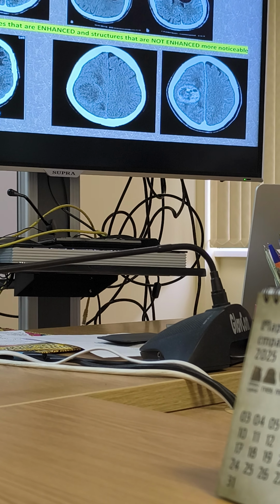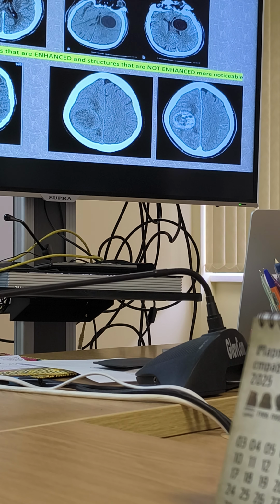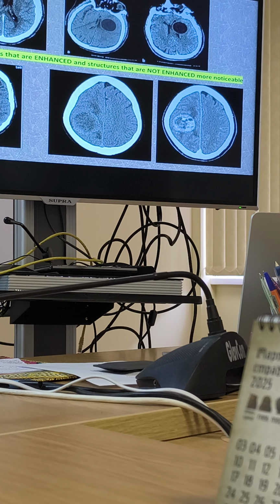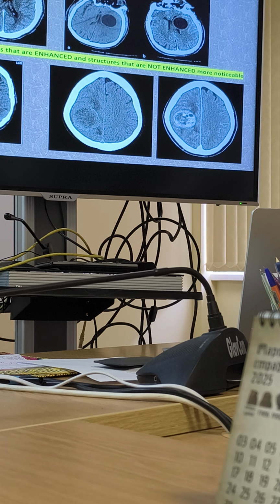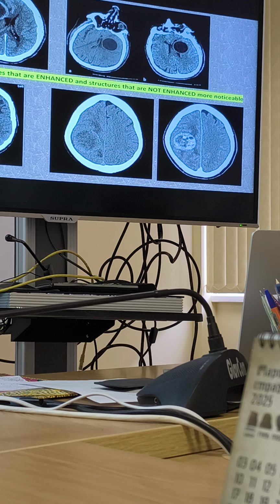This is a non-vessel thing. Then what about soft tissue in the brain? It is also non-enhanced. It depends on what kind of soft tissue. A cyst filled with fluid is soft tissue. It's non-enhancing because it doesn't have vessels. But if it's a tumor, it has vessels and it's enhancing. So all the other pictures show the situation when we see something which is whiter, yeah, in a circle. What about the cavity filled with pus?